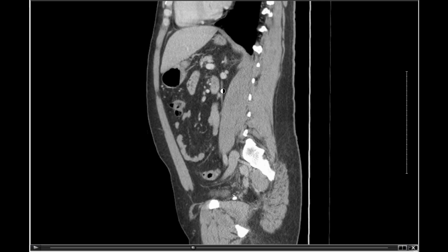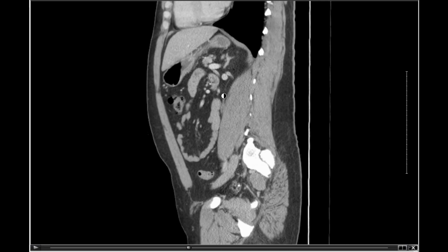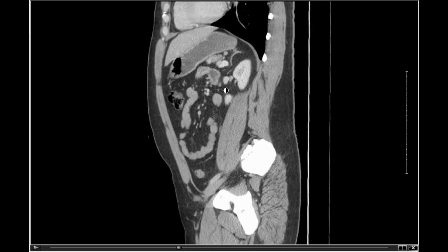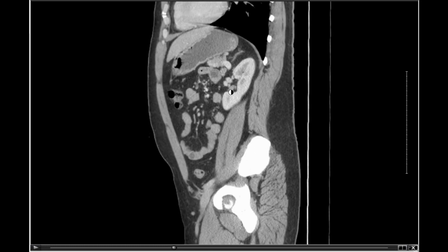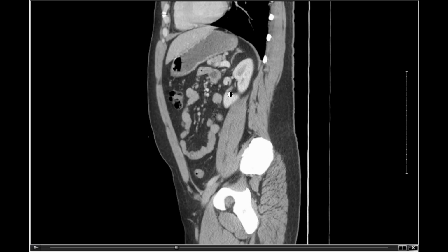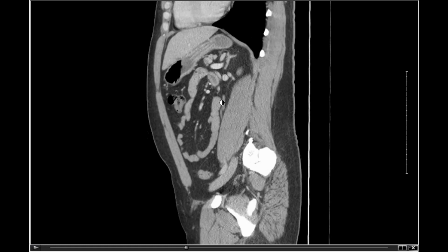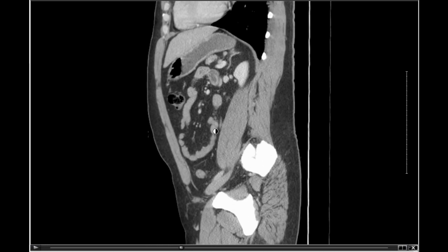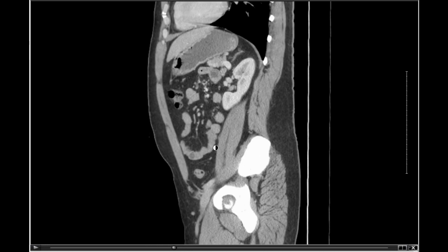And this little stripe right here I think is interesting. Let's see if that's the ureter. Let's follow it a little further back. Nope, the ureter is actually this guy right here. So see this little blob just above the indicator? Watch it. We're going to go down, and it's going to get small. The ureter is small. Transition down through there. It's actually going to pass a little more laterally, so you've got to back up a little. Follow it further down, further down.